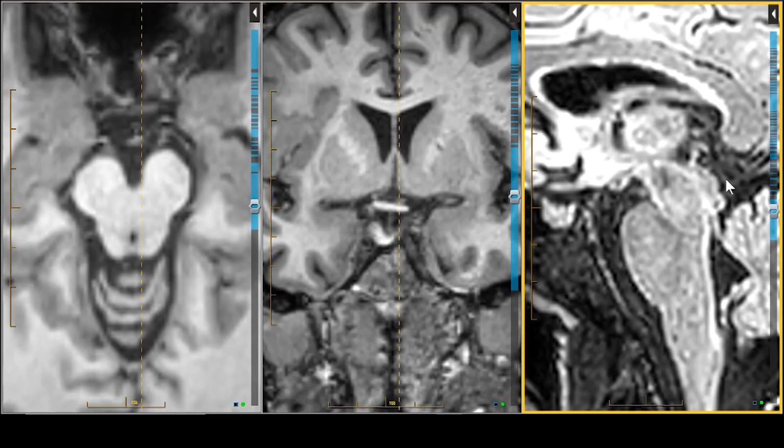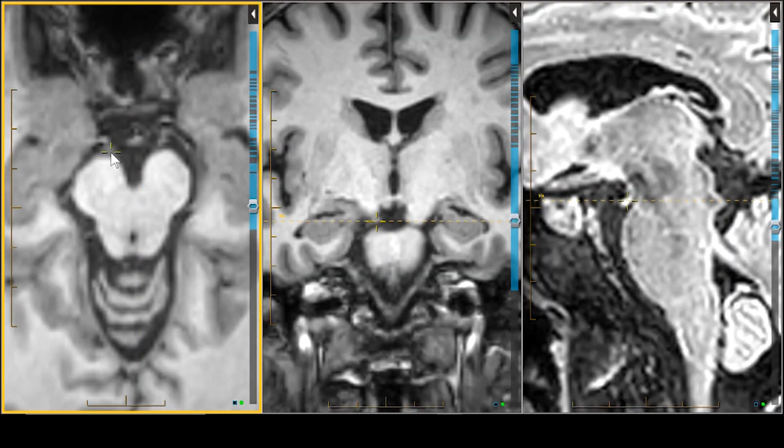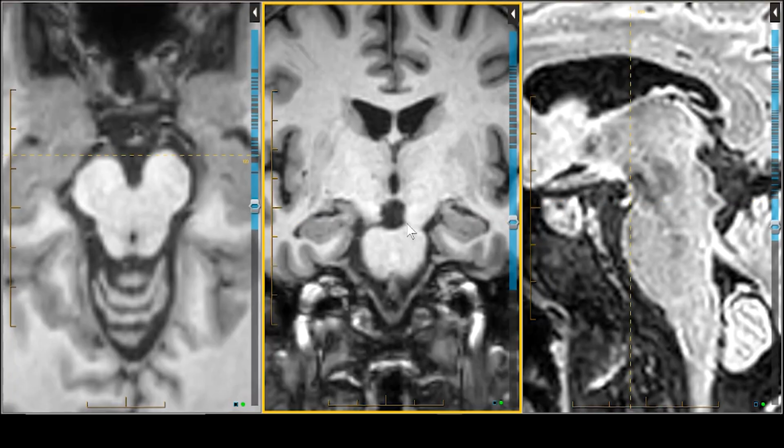nerve. You're seeing some wispy, spidery structures here, but the one that is most round right there is the trochlear nerve itself. Now, another trick is to find the third nerve. So let's cross-reference the third nerve in the interpeduncular cistern right there. There's your third nerve on the patient's right. There's the third nerve on the left.